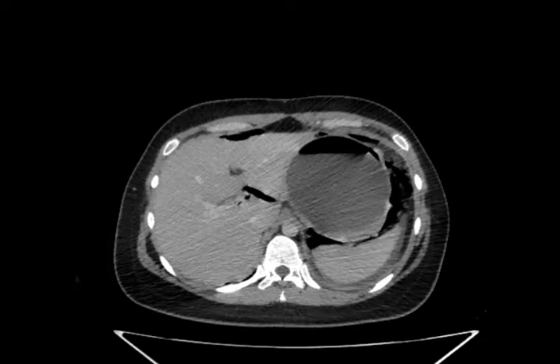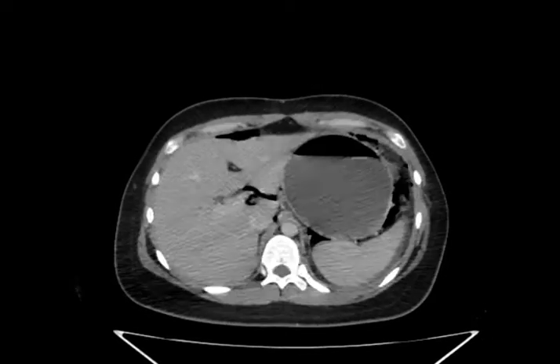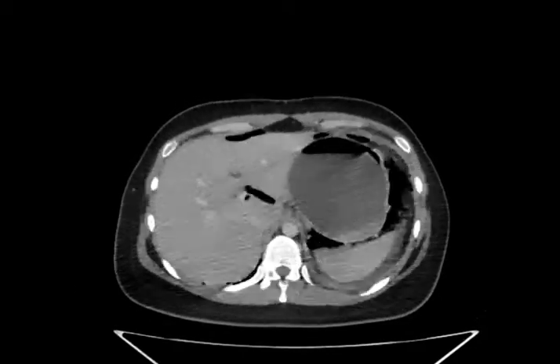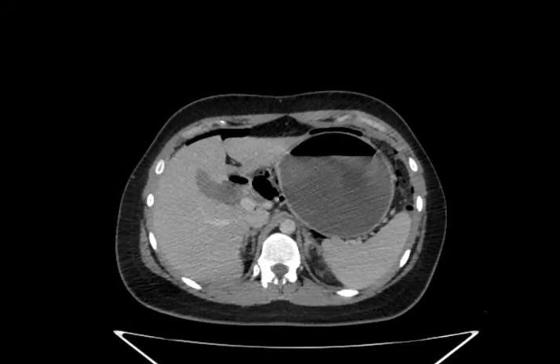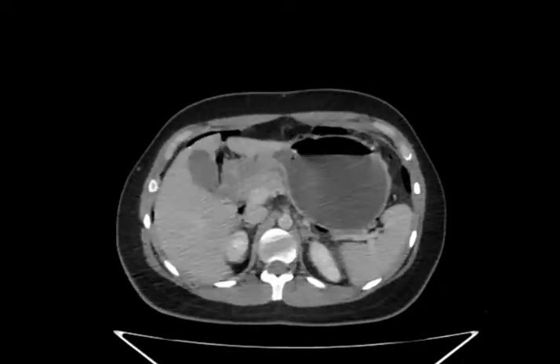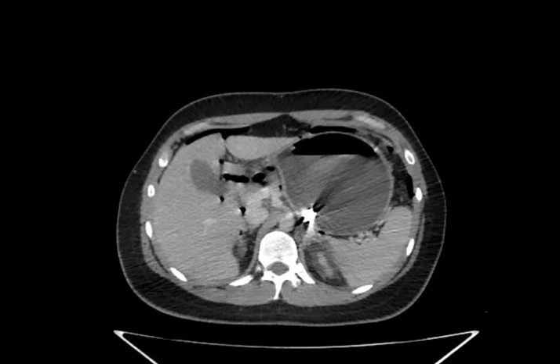Why is there free intraperitoneal air? The patient refused to take oral contrast, by the way. Why is there free air? Perforation. It's a very rare complication of endoscopy, because you have no opening of the skin. They're putting the balloon there, and the stomach perforated during the insertion of the balloon or after.